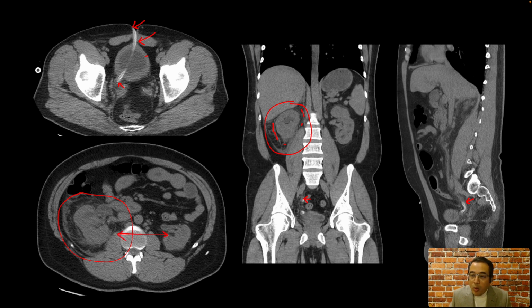And so the CT was acquired without contrast because they presented with flank pain, and a CT renal stone protocol was performed, which is always done without contrast to look for hyperdense renal stones.